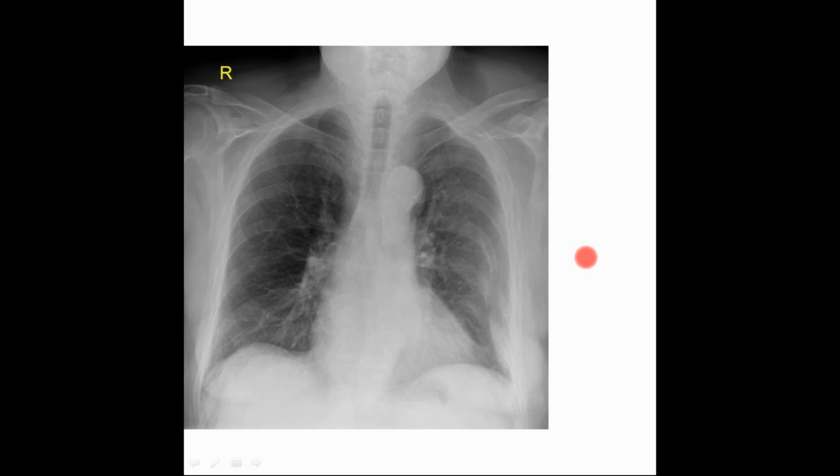Yes. Which fracture are we talking about? Yeah, a fracture on what side? Yes, very good. So that is why, see, initially your first 10 responses were limited to Sarthak. Okay, that's good. So Sarthak pointed out first and Sparsh as well. So that's very good. So for the first 7-8 responses, you were focused only on the lung and the heart.